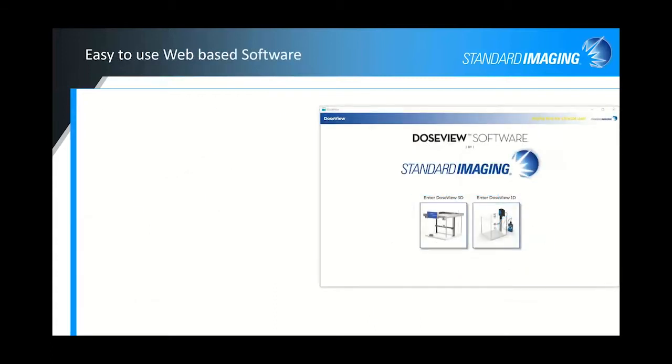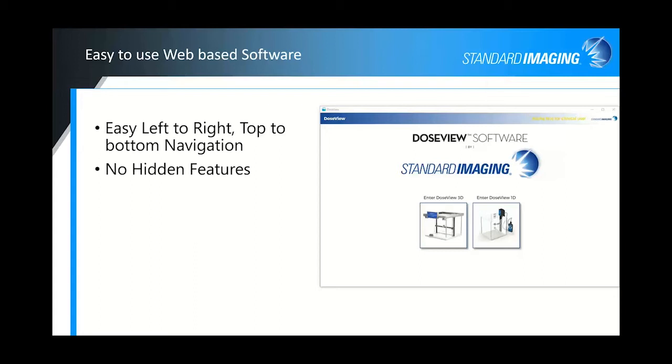But like I said, I wanted to jump into the software here, and it's got a web-based interface. It is a separate application, but it has the look and feel of a web app. It's easy left to right, top to bottom navigation, similar to anything you've been using for the last probably 30 years since Windows and Mac software came out.